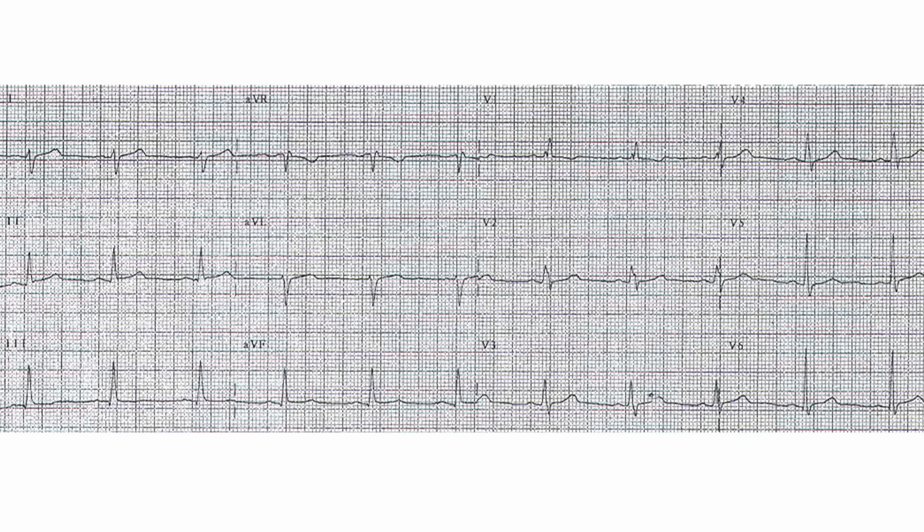Same to define non-specific intraventricular conduction delay. You need a QRS over 110 milliseconds without a specific feature for right or left bundle branch block. So here, actually, I don't think we have delayed conduction. It's two, maybe barely 2.5 boxes. So it's less than 110 milliseconds. So there is no bundle branch block.